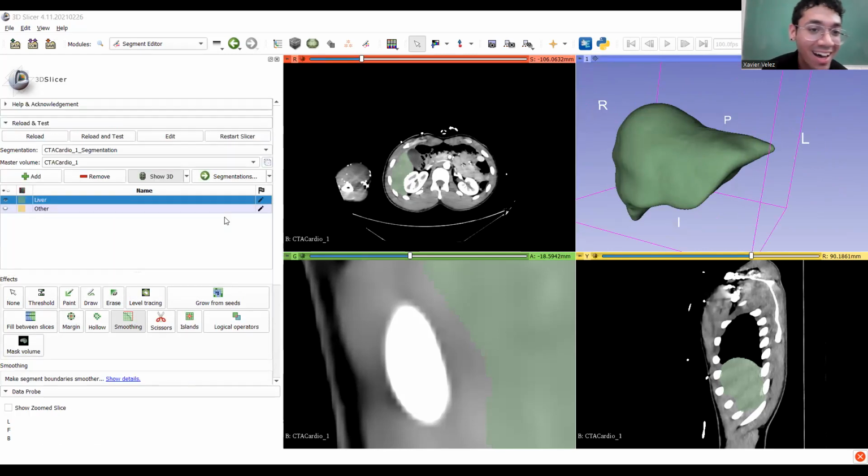All right. So now that we've got what we want, we're going to export this, and then we're going to get started with the part where we ask, how do we get it ready for 3D printing? And that part is pretty quick actually.